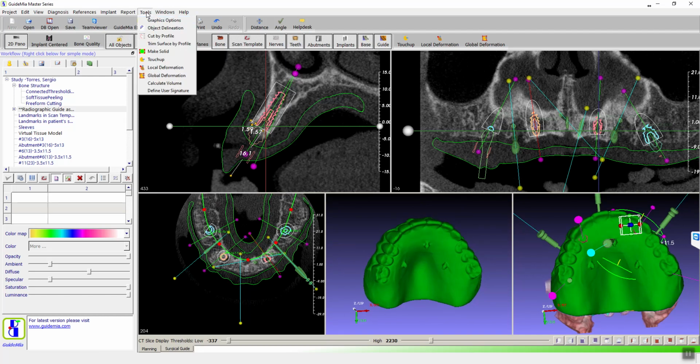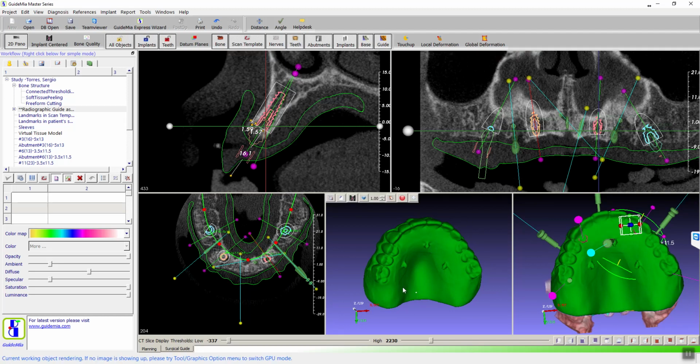we have two options. When we do the segmentation, we have the cutting tool there, and then we have this tool. We can trim. We can cut by profile, and we have this function. And we can cut a hole here. If we don't like the points, we can use the delete key on the keyboard.